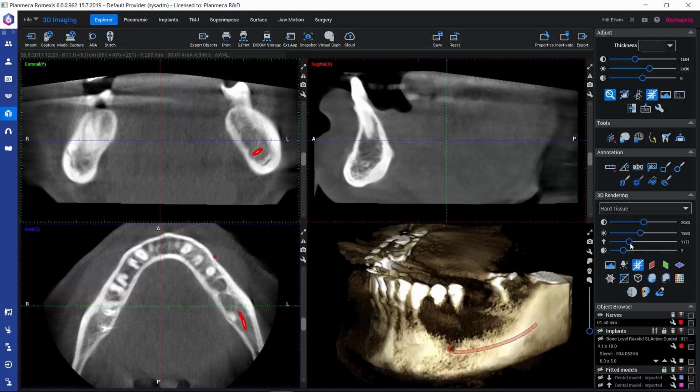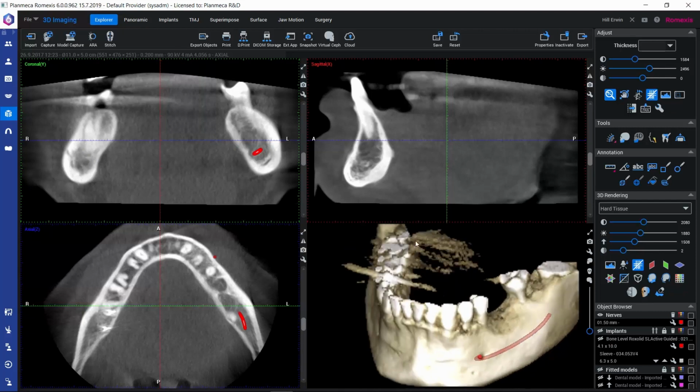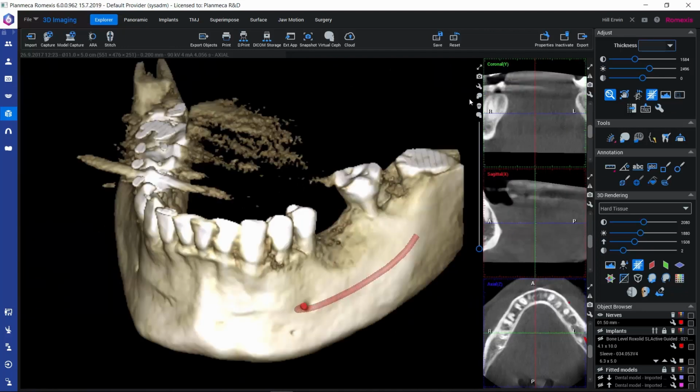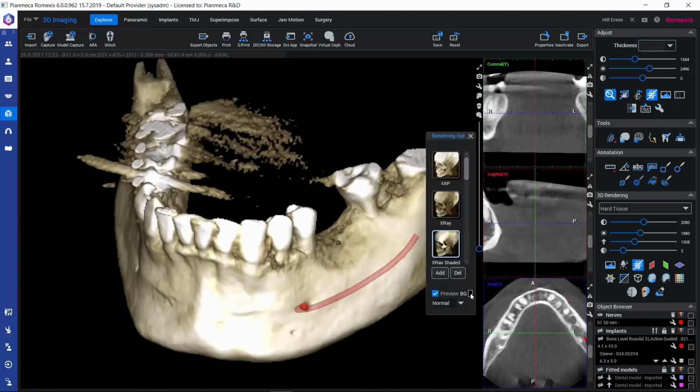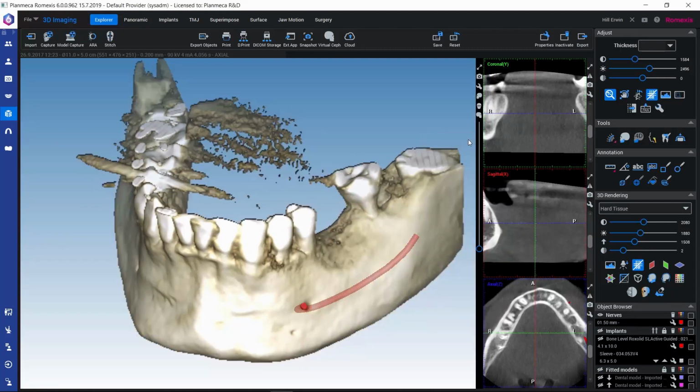And then let's take a look at how we could actually remove just some parts of the volume. So let me maximize this 3D rendered view, and also we could change the background color for the 3D rendered view so that we see better the artifacts that are remaining. We could get rid of these by this clean 3D rendering tool here under the 3D rendering tools.